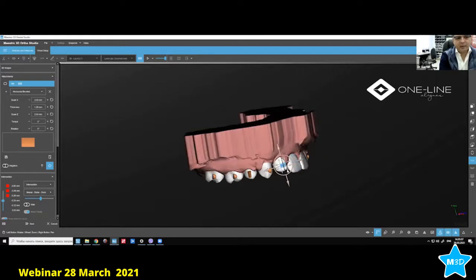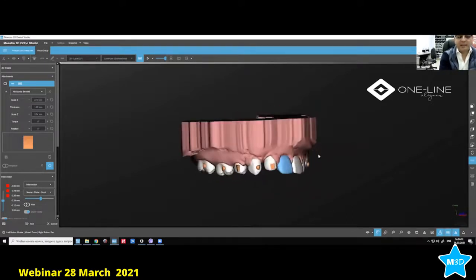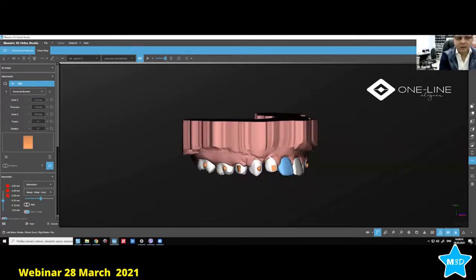You need to go bigger near the corner of the tooth, and you can just make it a little shorter, a little thinner for extrusion. And what will help is in the future, if you need buttons, you have enough space for buttons, you know. Yes. In case you need buttons in the future. I think I made this clear.